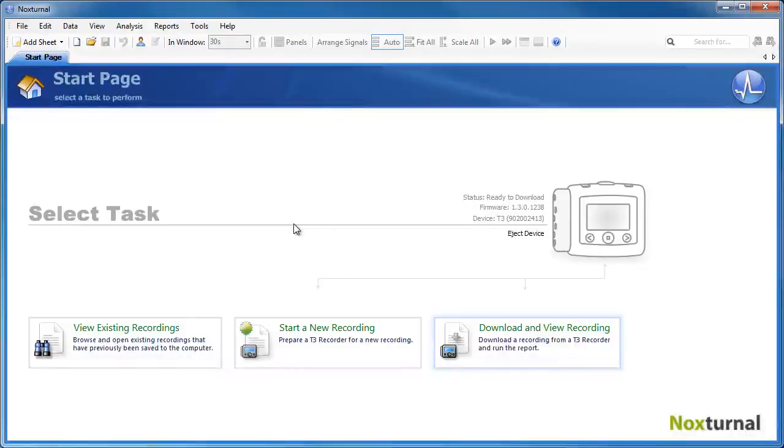You can change the default settings for a computer by following a few steps. It's not very simple, but it can be done, and that might simplify many tasks that you need to perform. And also if you need to distribute the same settings over all computers in a network. So this is one way to do it, is to modify the default settings for a specific computer.